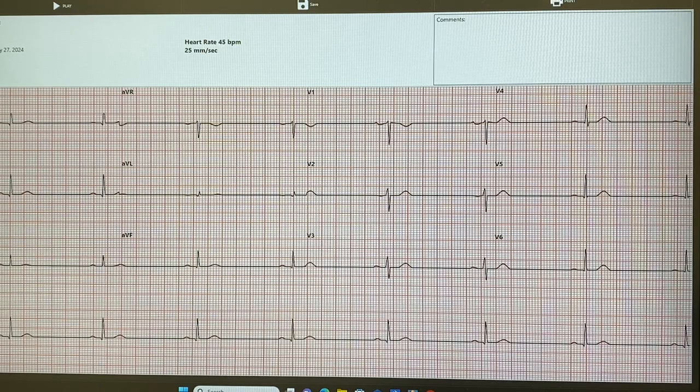So now what do we have? There are normal P waves. It's a Brady. Sinus bradycardia. Very good. You know it came from the sinoatrial node, which is why you're calling it sinus, because it meets all of the normal criteria. Pacemaker problems. Make sense? Yes.